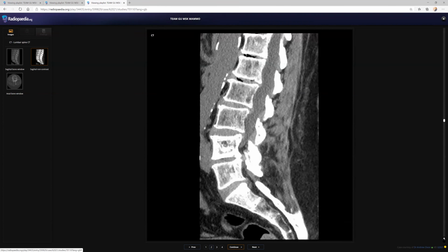So by looking at the vertebra, do you still think it's metastasis? Initially, I was thinking of some sclerotic lesion, like hemangioma, which sometimes becomes sclerotic, or lymphoma. Will hemangioma affect the posterior element also? Sometimes, but when it is very big and expansile, it can involve the posterior element. Is it expansile? No, it is not. Is it aggressive? It is not. Maybe some depositional disease.